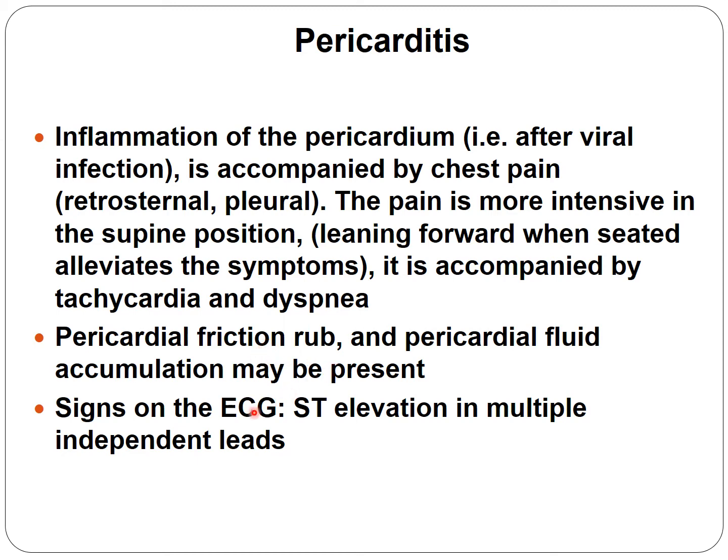Signs on the ECG: the ST elevation in multiple independent leads. So those ST elevations do not depend on the coronary supplied structure.